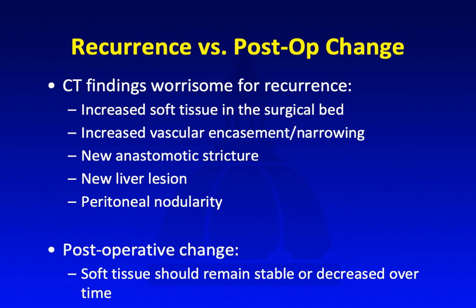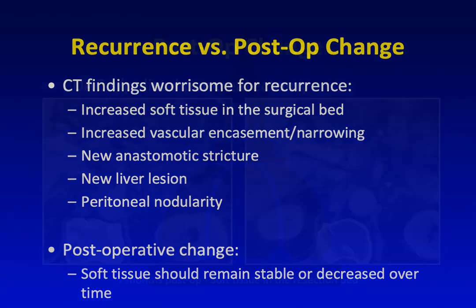Other common sites of recurrence for pancreatic cancer patients would be in the liver and within the peritoneum. The post-op changes, the soft tissue should remain either stable or gradually decrease over time.